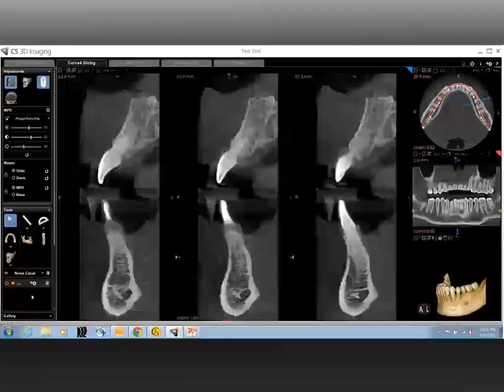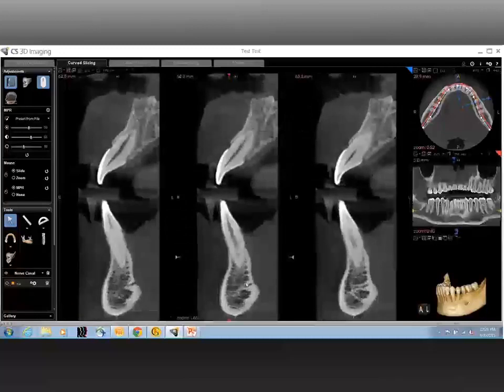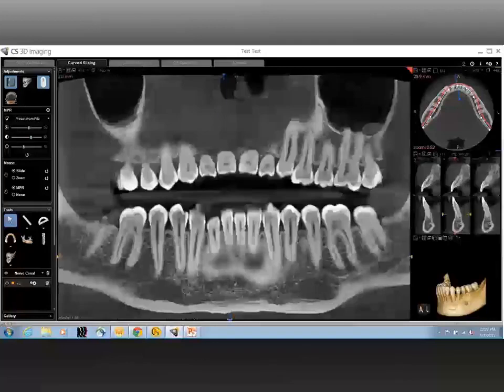That is very well noted. Let me just scroll around and get to the exact view. That would show the lingual foramen. If you notice, it's just like the name implies. It is on the lingual surface, and that's where it is. Excellent. Well, I see in the software that you're denoting the L for lingual, and we're seeing that right there in the midline. If you don't mind, could you zoom in on the curvilinear view so we can see? There we go. Thanks. We're right there in the midline of the patient.